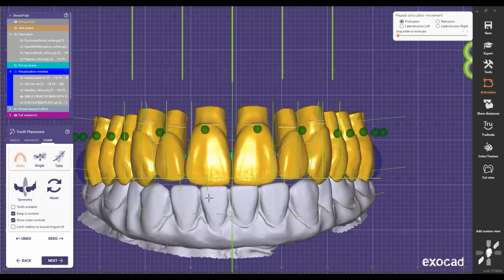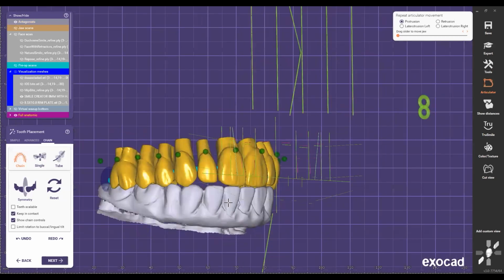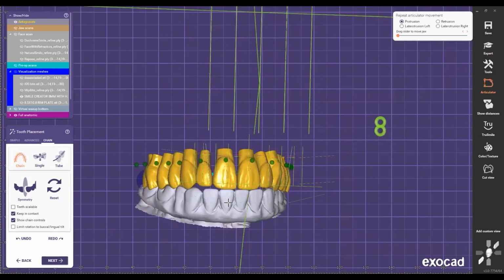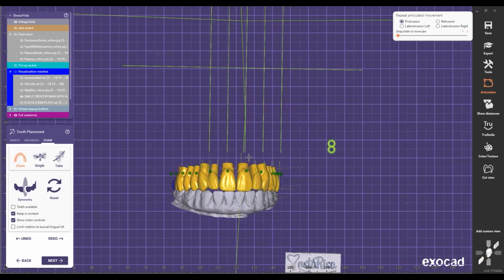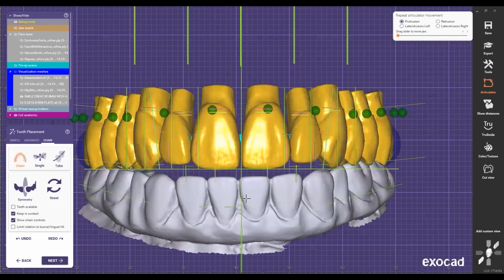And then later, once we do both, I can tell the doctor, hey doc, I have two options here. I can leave my design option ideal, like where it is right now, right here, right? Leave it there, and then the patient's gonna have that space there. And then we can tell the patient, okay, now we're just gonna fix the lower down for the next time.